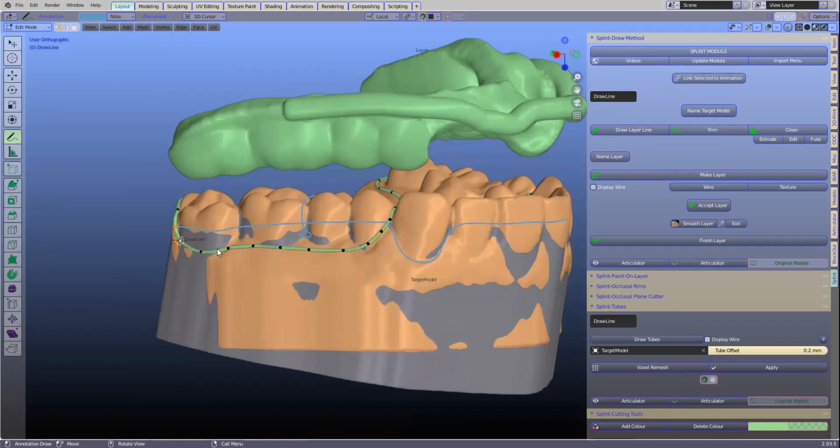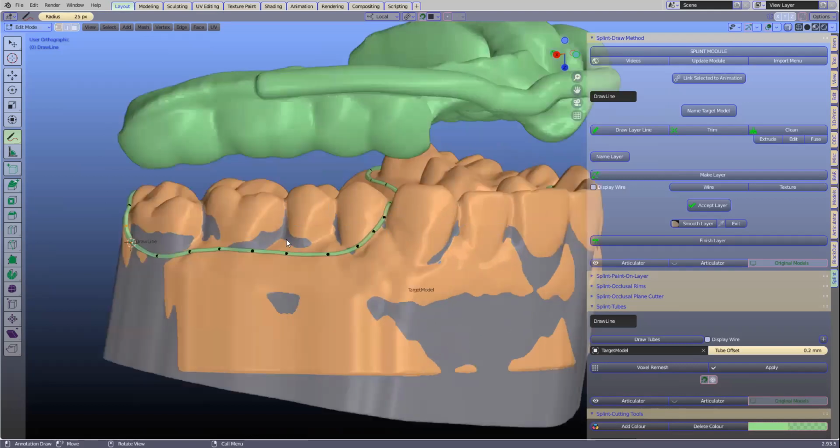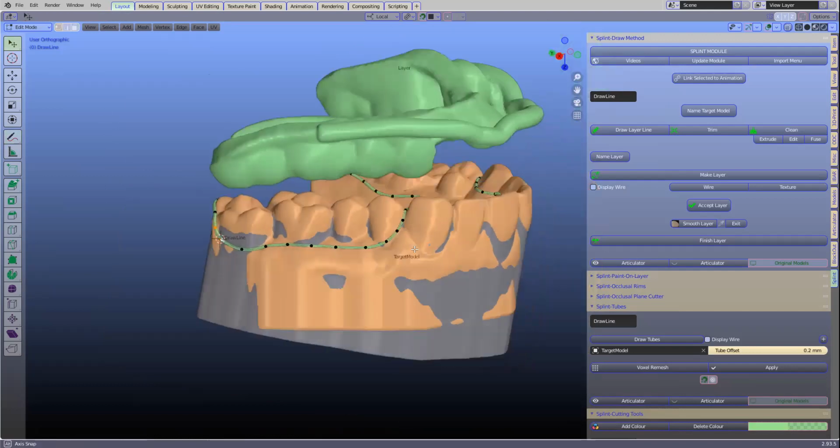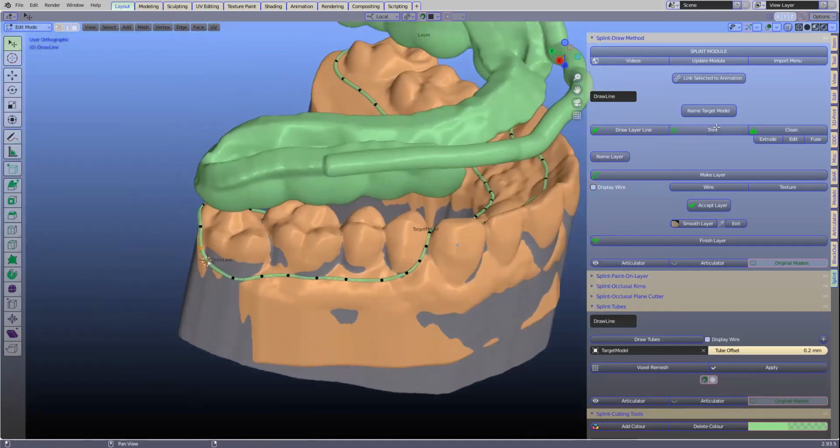So some teeth just don't have undercuts. Now that you mentioned ball attachment, is there a way to make an indent or a crevice for the splint to actually fit in there exactly like a ball clasp? In the model design, you can take the patch up tool and cut a sphere in there. But look, to be honest, I haven't tried it, but it's worthwhile looking into that. Anyway, so here what I'm doing is I've drawn the line and I'm going to click on trim.